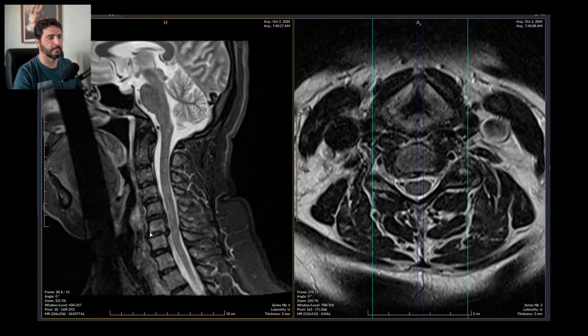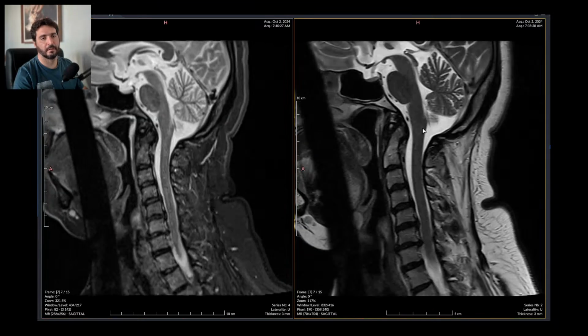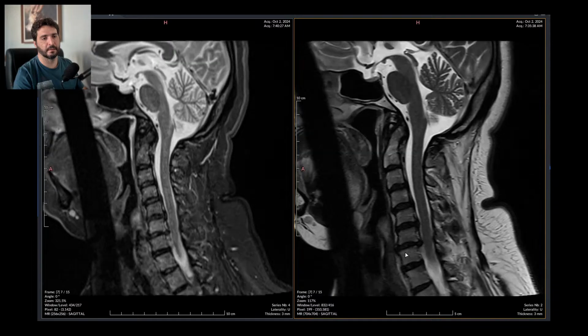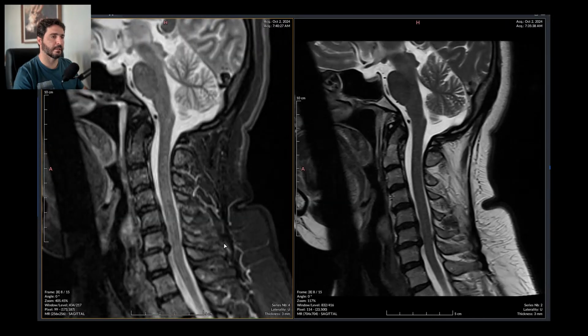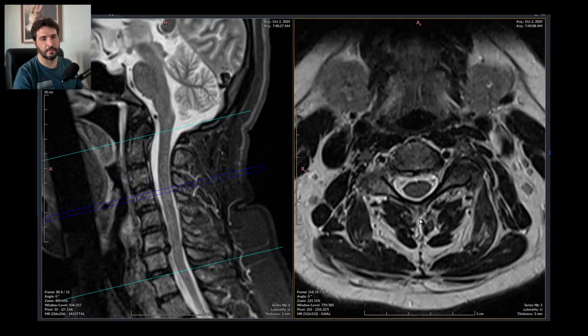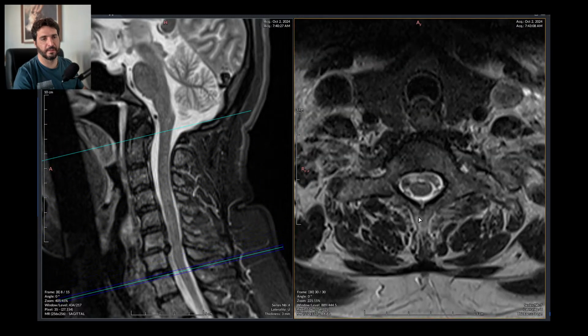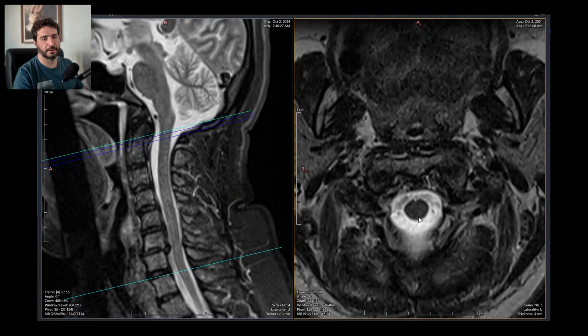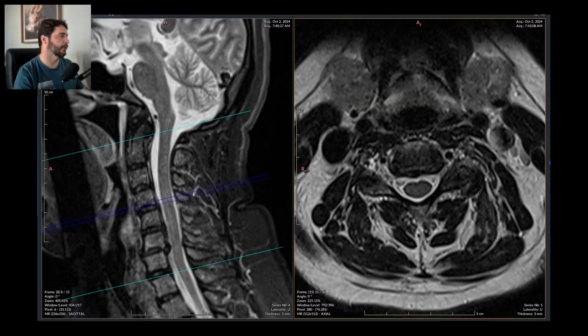There is some bone edema right here. Yes, also some fat deposits right there. This is chronic. This is degenerative disease, osteophytes and all that good stuff that causes a lot of pain. As far as I can tell, there is no lesion of the cervical spine, the cervical medulla. Just degenerative disease of the bone and the discs.